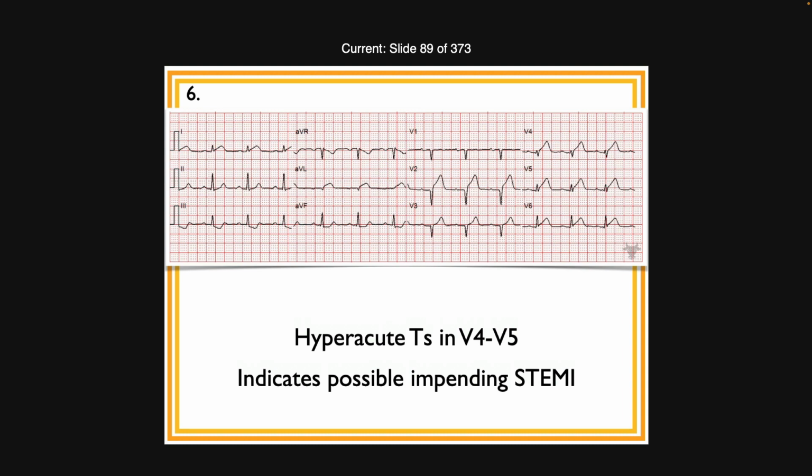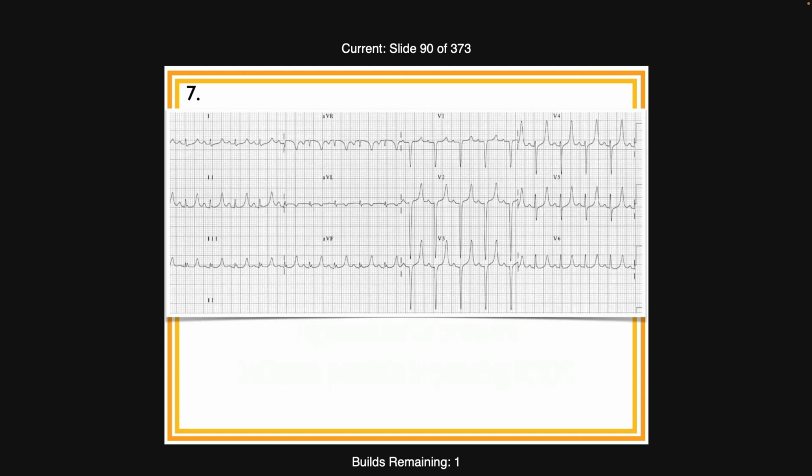So high lateral, because we've got all kinds of things here. We've got a little bit of ST elevation in AVL, plus the QRS fits in there. Again, very straightened out T wave here, and then reciprocal changes in 2, 3, AVF. So, yeah, but that wasn't what I was asking. So you're exactly right. We also have hyperacutes here. And then number 7, Kyle?